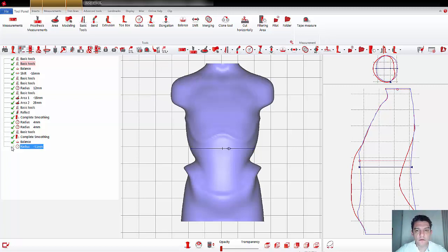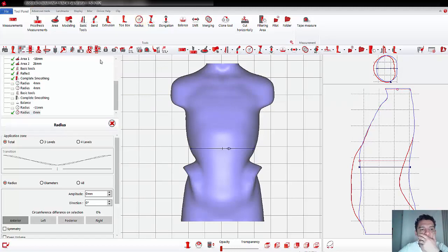This is the radius, okay, the balance done. So in this case, where is this one and this one? Okay, in a real case, we apply pressure, we control from the anterior and posterior, and sometimes there are people that prefer to increase the ML at the axilla, so you can do something like this.